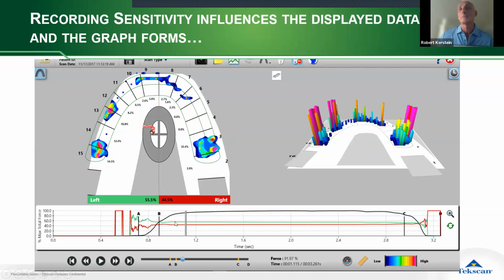The red line and the green line are the right half of the arch and the left half of the arch, and they are very flat and horizontal. Because the sensor is so active, it's very easy for the patient to bite into it and create data that is basically taking out all the dysfunction. And you can see the balance is off by 5%, despite them missing some teeth.